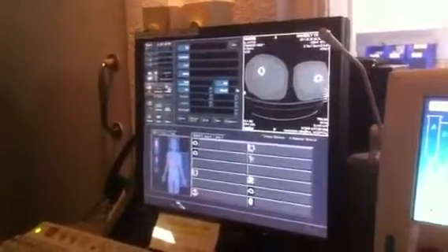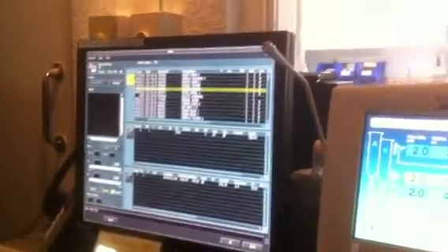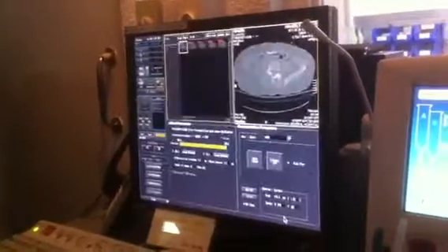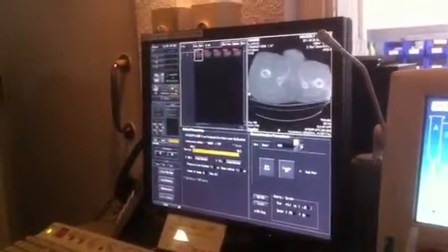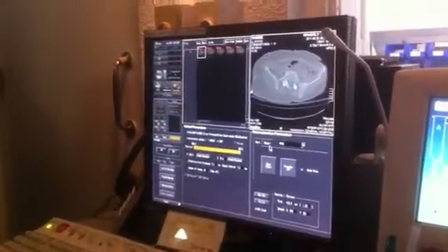Okay, so now I'm going to go back into raw data. And after you picked the 7, did you click something to get out of there? Did you quit or close at the very lower left-hand corner? Okay. Select study. And now look, I have images that I can use, because maybe I just wanted to reconstruct the hip out of here. Right? So I'm going to reconstruct the hip out of this thing.